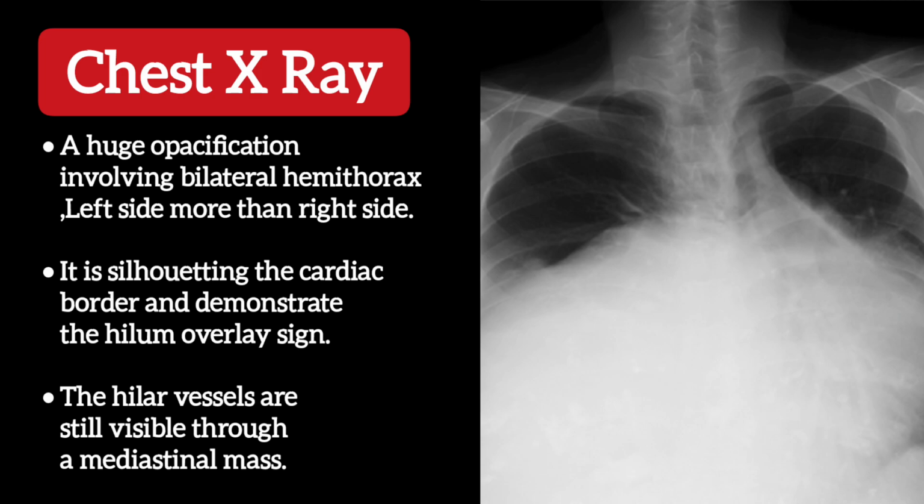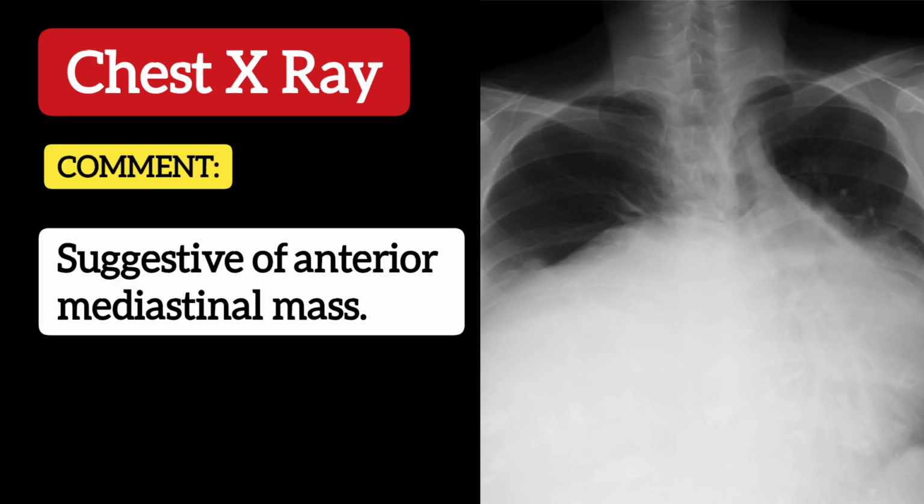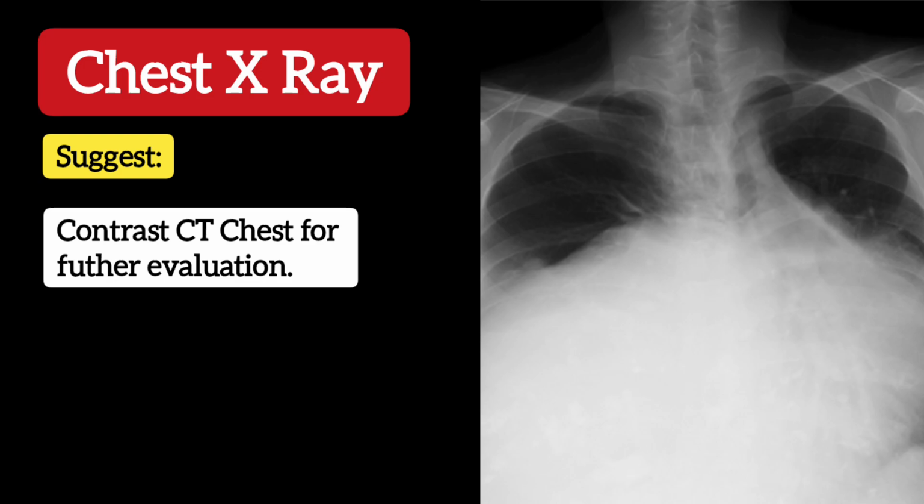The hilar vessels are still visible through a mediastinal mass. This indicates the mass does not arise from the hilum. Few tiny specks of calcification within the mass, suggestive of an anterior mediastinal mass. Suggest contrast CT chest for further evaluation.